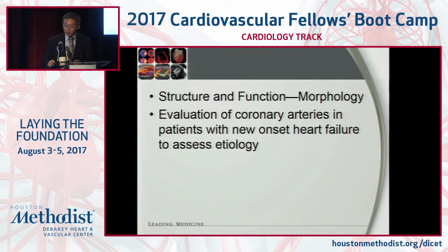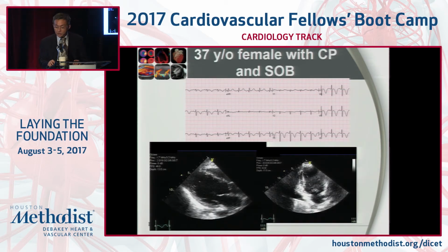And the third major indication is for patients with new onset heart failure, low ejection fraction, in which they don't have history of coronary disease or myocardial infarction. EKG is unremarkable. I would say instead of going to the cath lab, CTA is an excellent modality to rule out disease. Obviously, this is a patient with very low pretest likelihood, 37 years old female with chest pain and short of breath. Very dramatic ECG changes, as you can see.